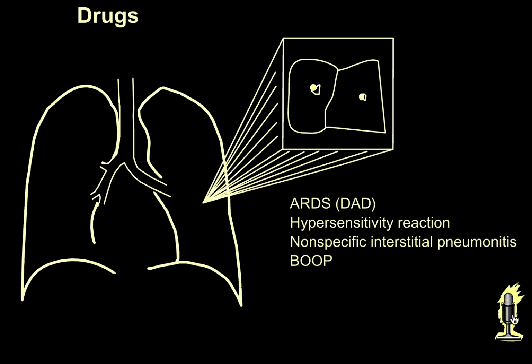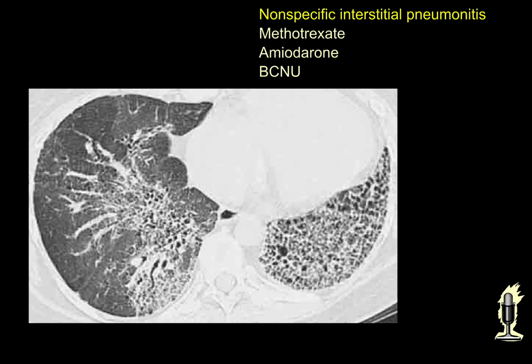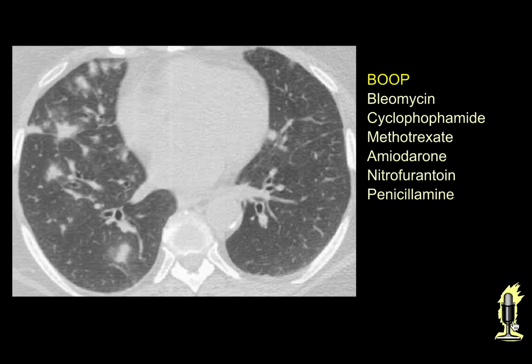Last but not least is drugs. Drugs may cause nearly any pattern. A pattern of edema is common with cytotoxic agents. NSIP is also common with the chemotherapeutic agents. A BOOP-like reaction is seen with many drugs. Note that a single drug may cause more than one pattern.